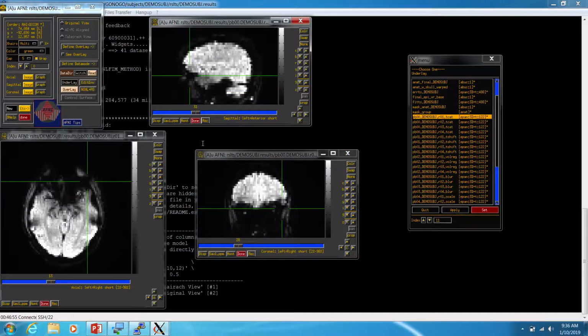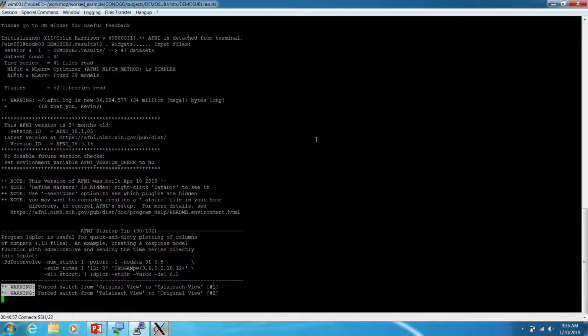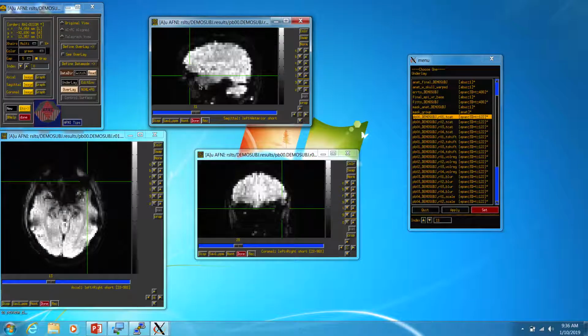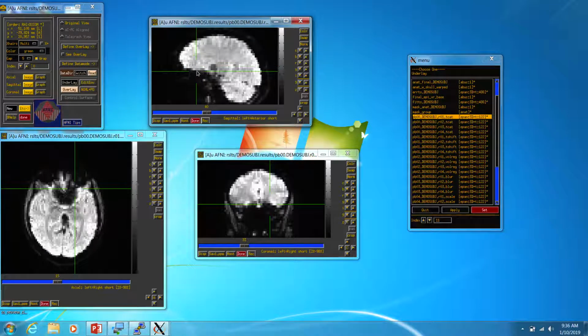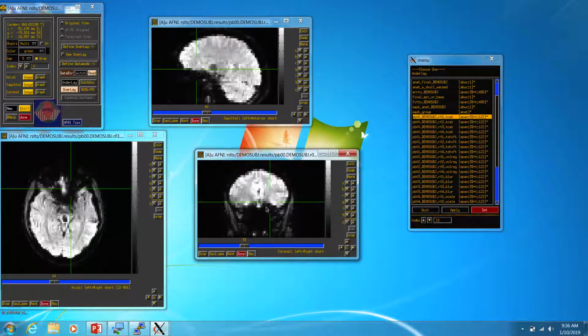The other thing you'll notice is right here. Some of this is just where the frontal lobe starts, but you'll see there's a little bit of disruption, particularly as you move about here. You notice there's a little bit less signal. This looks a little exaggerated in here.